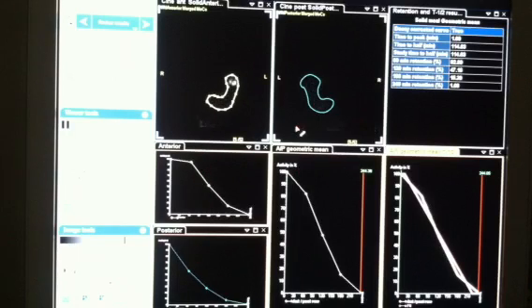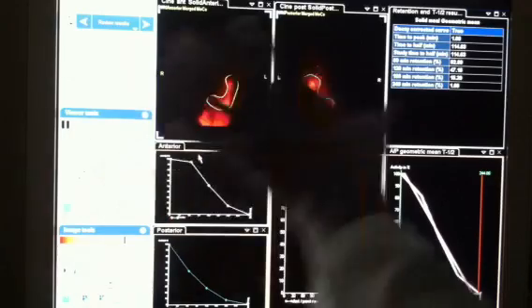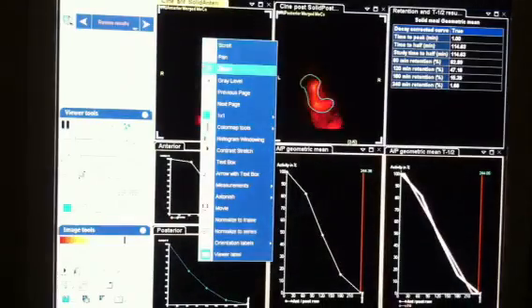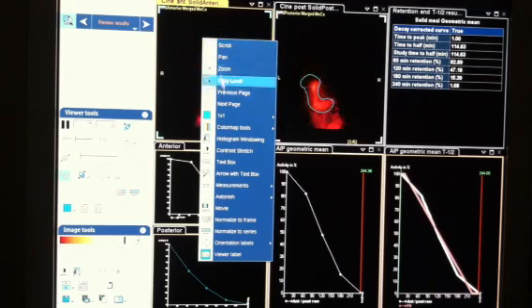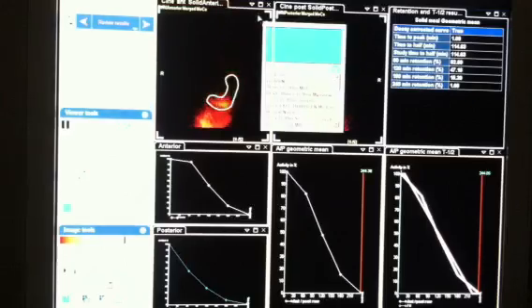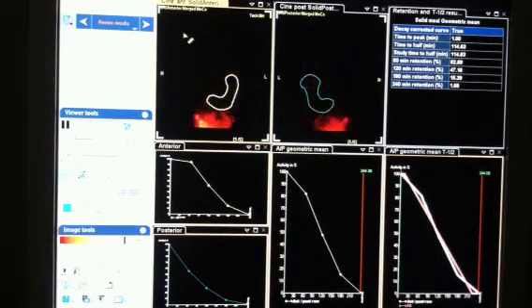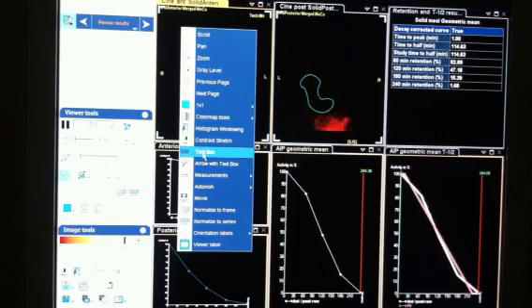We're going to use this as our cine splash page. So I'm going to change the color, something that can be seen, and bring up the intensity all the way up to log 3 so you can really see it in there. Now we're going to populate this with some information. Right click to bring up the box, left click on text box, which brings up the little crosshairs, place that there and put your initials. Do it one more time.